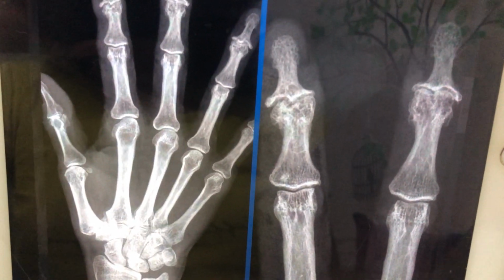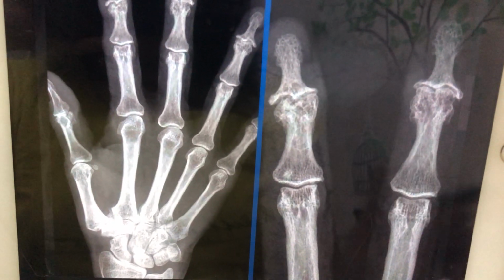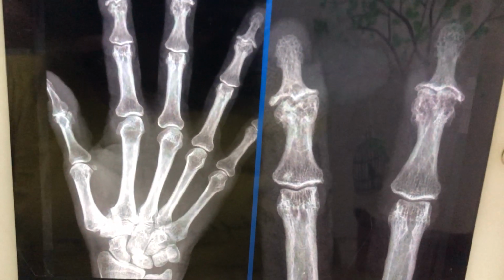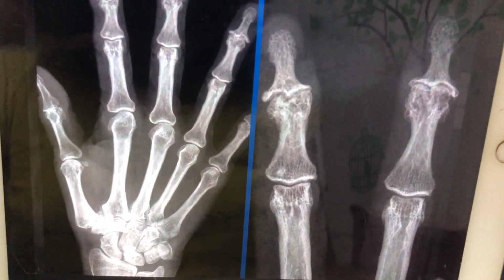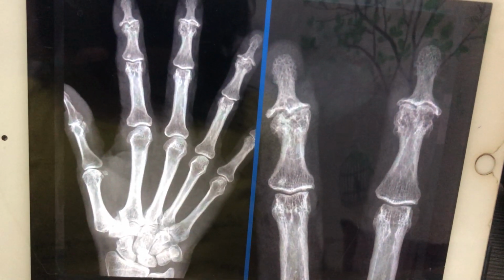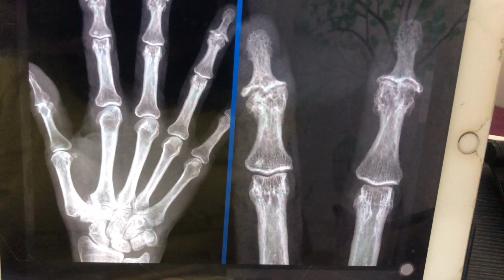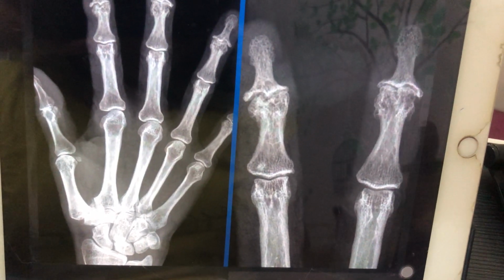This is also described in certain other osteoarthropathies, but it is very characteristic of erosive osteoarthritis. Apart from that, there can be ankylosis of the interphalangeal joint also, where the entire joint is fused. Of course, you can see that there is uniform joint space narrowing. The distribution of joints is the same as osteoarthritis, except the interphalangeal joints are usually more involved, with the DIP being more involved than the PIP. As far as the soft tissue is concerned, there is intra-articular proliferation of the synovial tissue, and there are a few subcutaneous swellings.